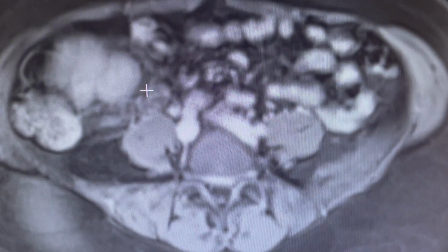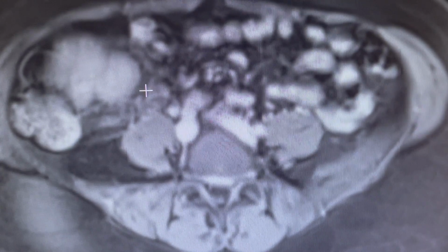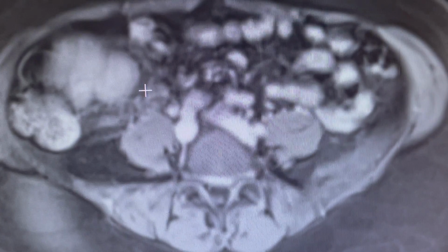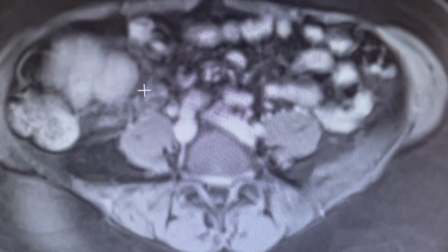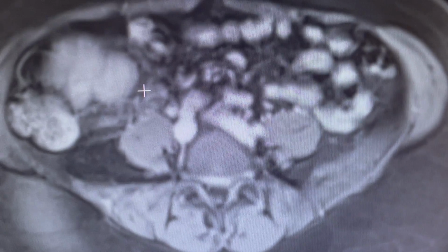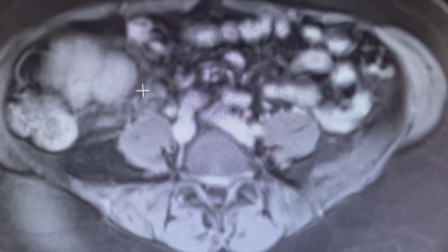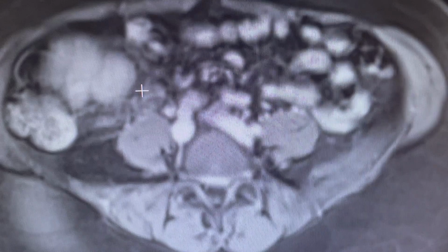Now, intense arterial enhancement, as I said, we see in those 4 lesions: FNH, which is focal nodular hyperplasia, hemangioma, metastases, and HCC. But it didn't have high signal intensity on T2 for the small lesions, which can be seen in all of them when they're very small.